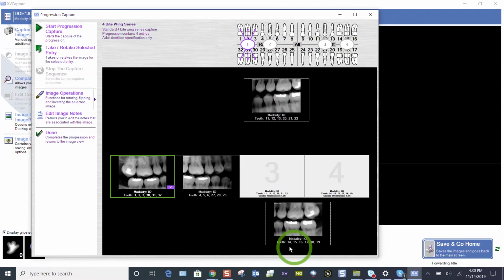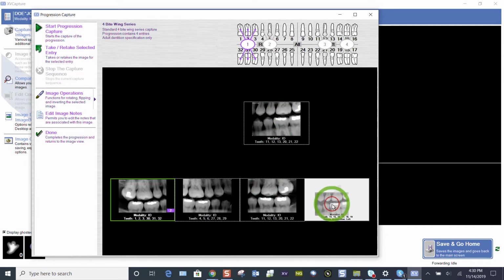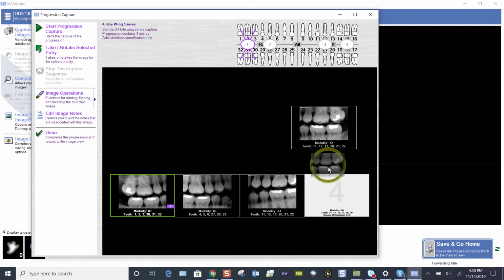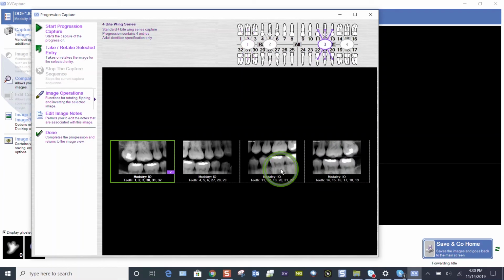Please use this black border on any layout to drag and drop those images out if you need to. Left hold and reassociate them with the tiles that they actually belong to. So you can left hold and drag and drop. If you right hold, you're going to move the whole tile, and that's not what we want to do.